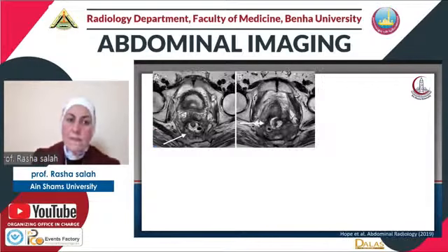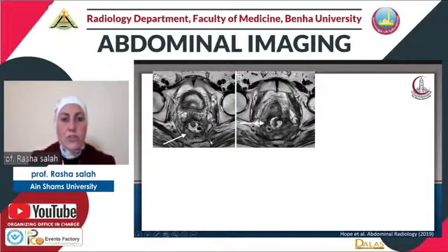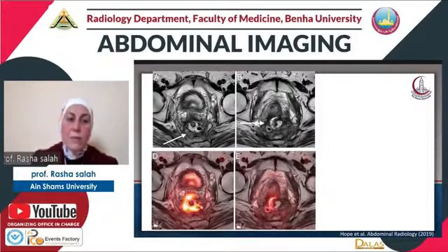And also for assessment of recurrence, sometimes the routine conventional images become very bizarre, like over here, is this a recurrence or is this post-operative granulation and fibrosis? This is very bizarre on the conventional CT or MRI images, but if we add the PET component over here, then we can discriminate that this is not a granulation tissue, this is a true recurrence within the fibrosis located at the pelvis.